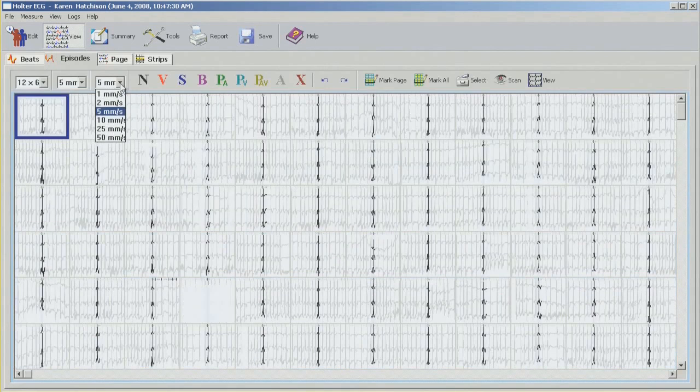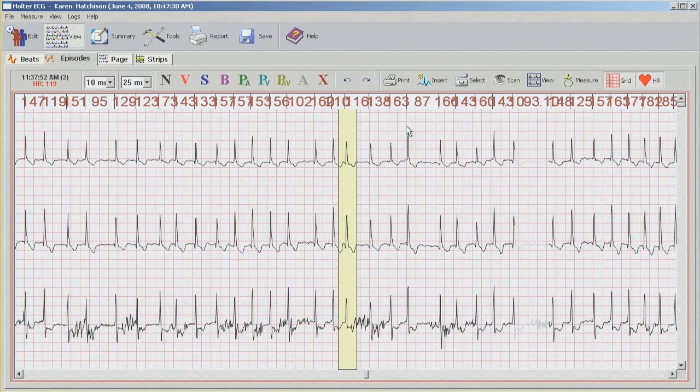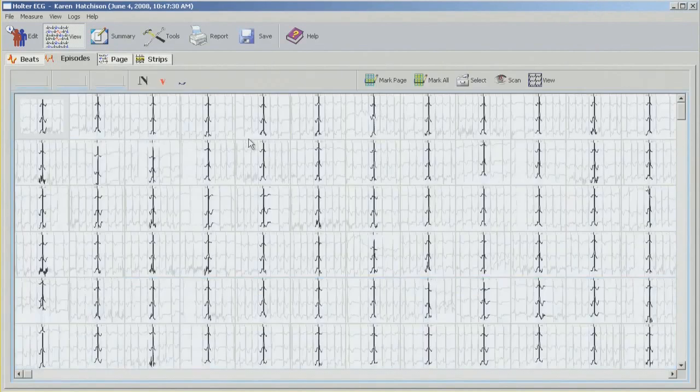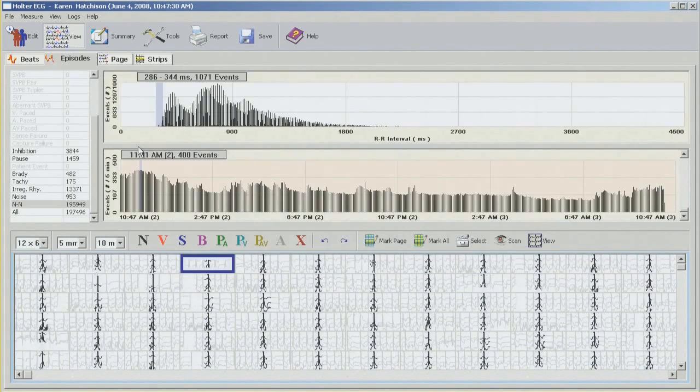Here I will change the speed again to 10, and this is our shortest NN, so just double click and select the label. Double click, tag any of the boxes, and use the Z button to go back to our previous screen.